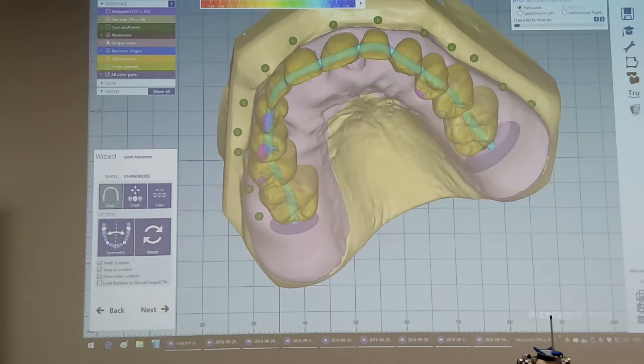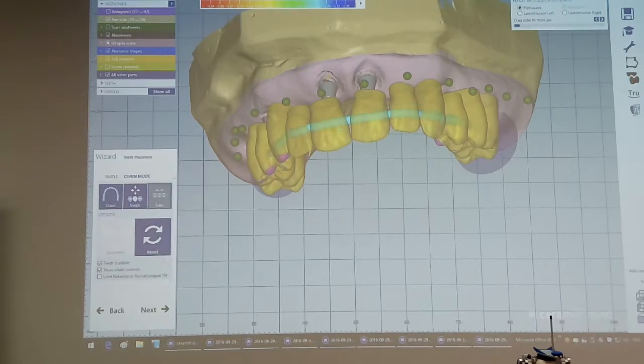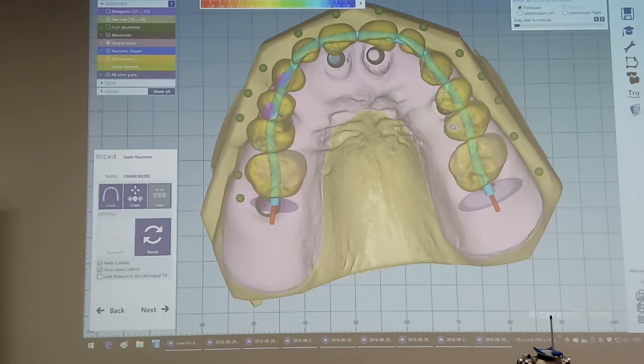And when you have finished all the movements and you will do small adjustments, finally you also have a possibility on the tube. It's like a rail. This is for the last finest adjustment.